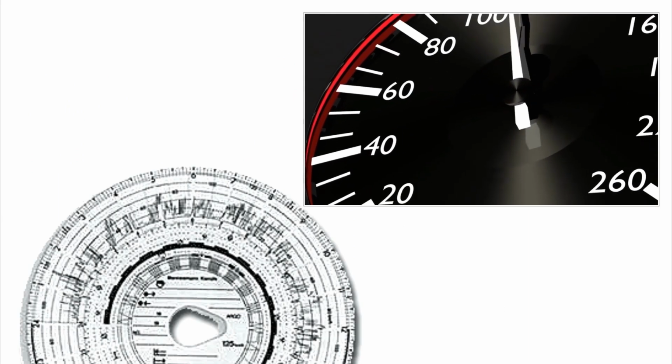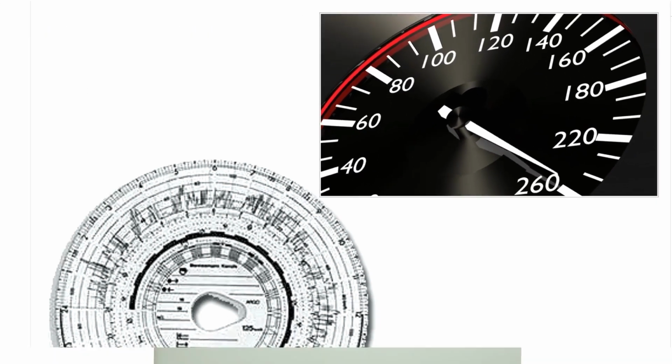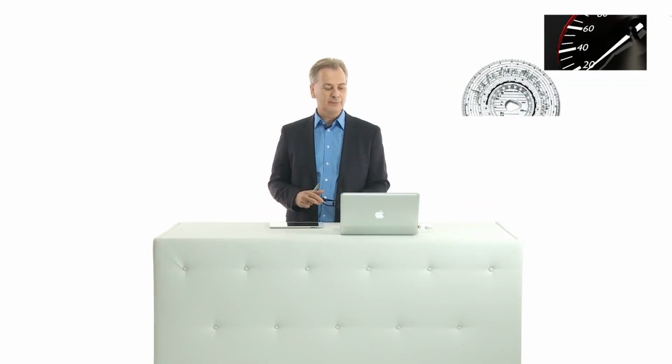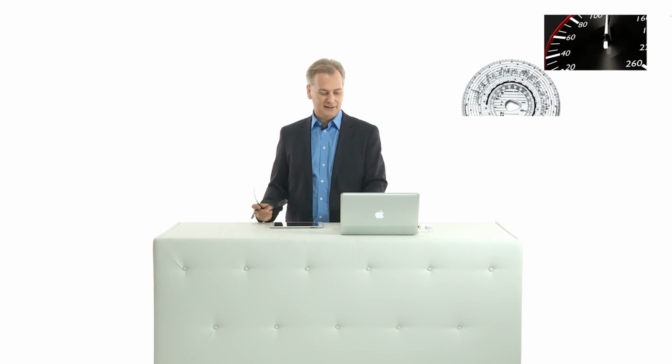Now, this is the method we use in echocardiography. Christian Doppler was an Austrian, Bernoulli was an Italian, and here we have the same connection as in this course. Anna and Bruno are Italian and I'm Austrian. In the imaging primer, we already showed you spectral Doppler, where we are able to trace the velocity over time, similar to the way it is done, for example, in trucks, where we track the velocity over time on this little disc.